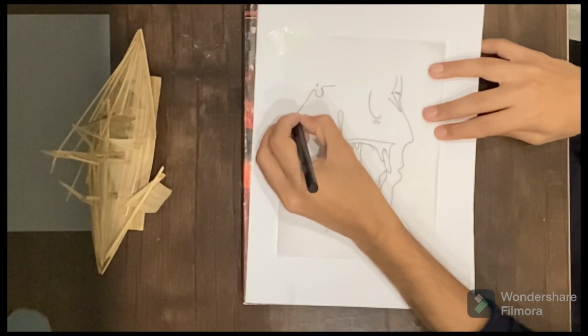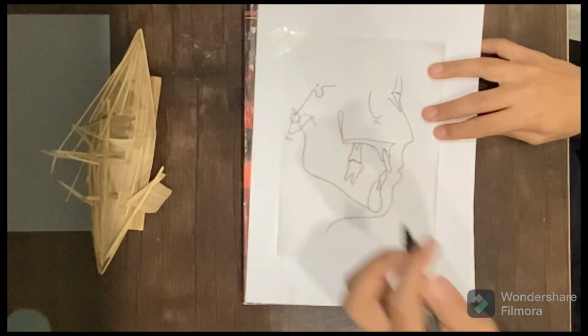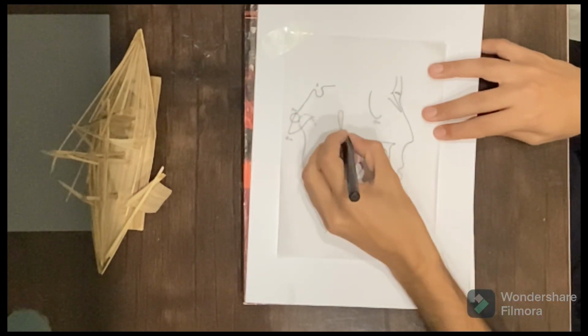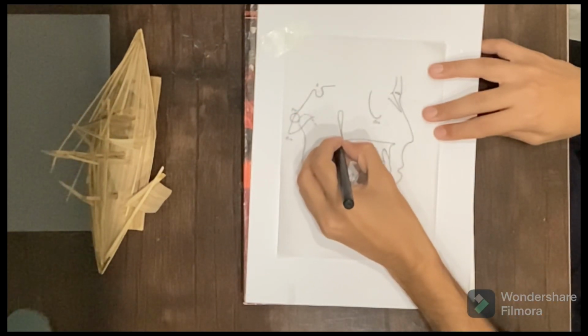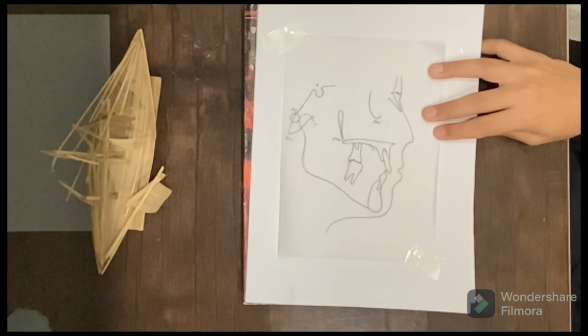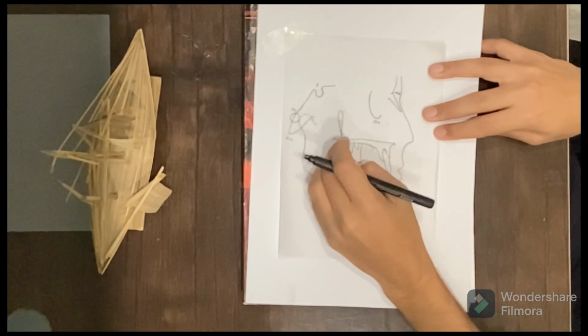Afterwards there is the porion point, PO. PO is basically the midpoint on the superior margin of the external auditory meatus. Then there is PTM, which marks the pterygomaxillary fissure point, the tip of the pterygomaxillary fossa, which is the intersecting point between the anterior and posterior margins of the pterygomaxillary fissure. So this point marks the PTM.